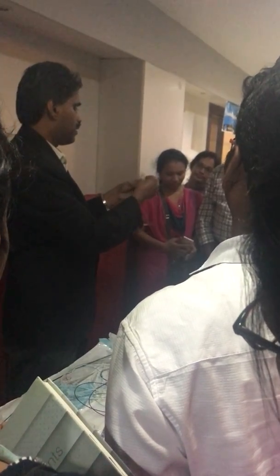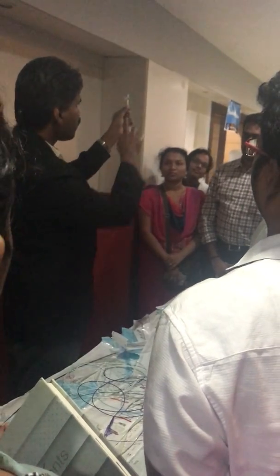The other important thing you should know is about this lock. See, there is a difference between this lock and the three-way. Have you seen a three-way? Okay. In a three-way, if it is like this, is that open or closed? The part with the knob will be open, and where there is no knob is closed. This is opposite. Here, where there is a knob, that part is closed. The rest of these two are open.